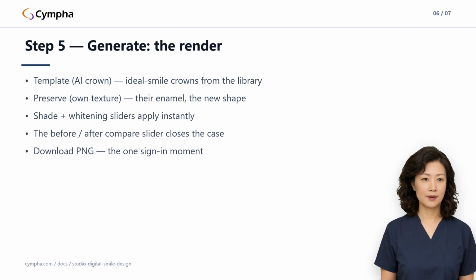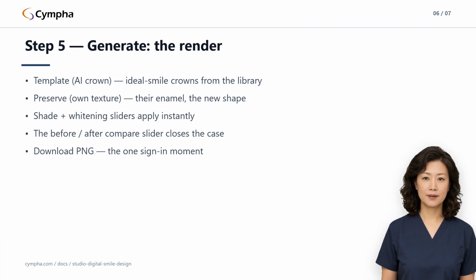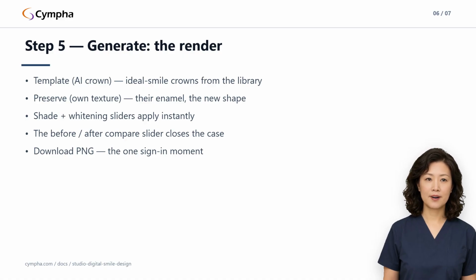Then, the case acceptance tool itself, the before and after compare slider. Drag it across the image while you talk the patient through the change. That slider, moving back and forth over their own face, does more persuasion than any brochure. When they're convinced, download PNG to share the result or attach it to the case. And that's the one point in the whole workflow where Studio asks you to sign in.